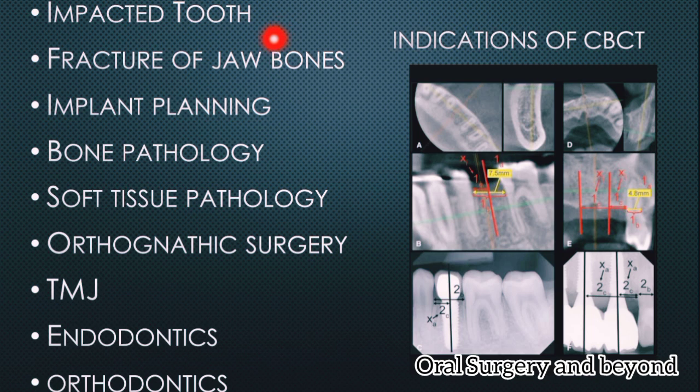Right? The next indication is fracture of the jaw bones. So we are able to see how many jaw fractures are present and how the fracture line is passing, right? Implant planning: the most common and most widely used application of CBCT nowadays is for implant planning.